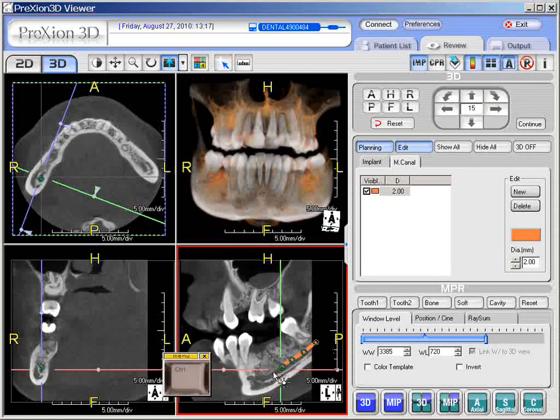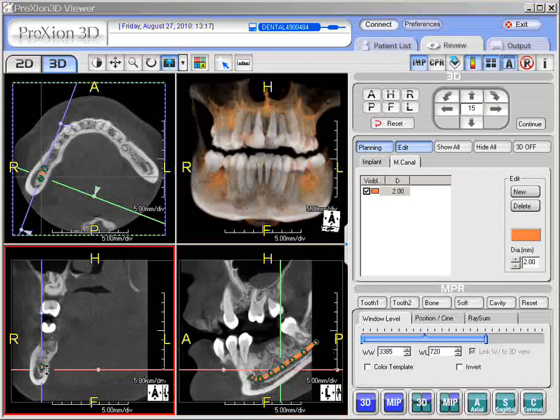I like them a little bit closer, just so if you go back to edit, you could go in and just grab the green circles. Now I did this a little purposely to show you, if you want to edit these on the other screens, you could go here, let's say in the coronal view. Let's take the crossbars off.